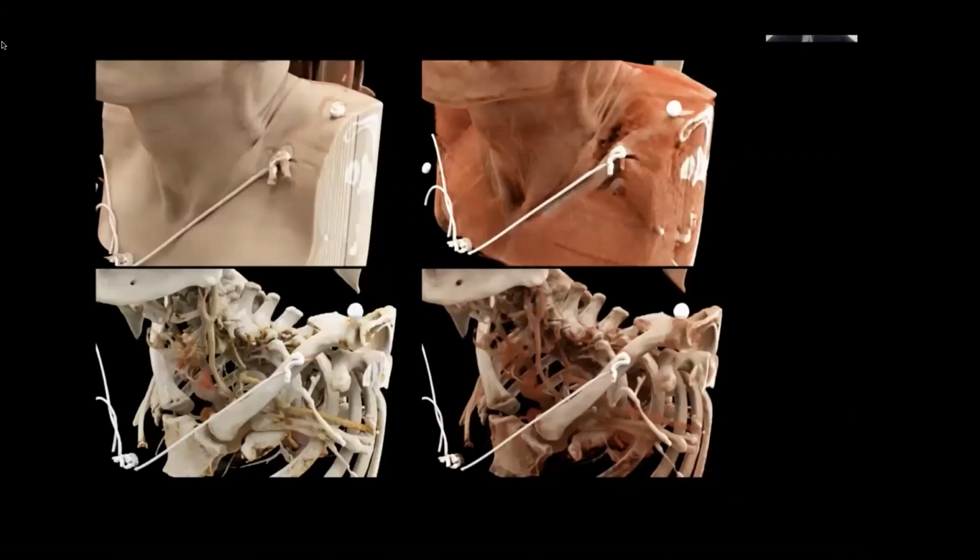So the short answer after all of that is to say that, yes, I think overall this is an accurate representation of the anatomic structures. But you do have to be aware of the fact that there have been several layers of processing, and that the layers of processing are dependent on individual decisions as to how they want to depict various structures. Did that answer your question?